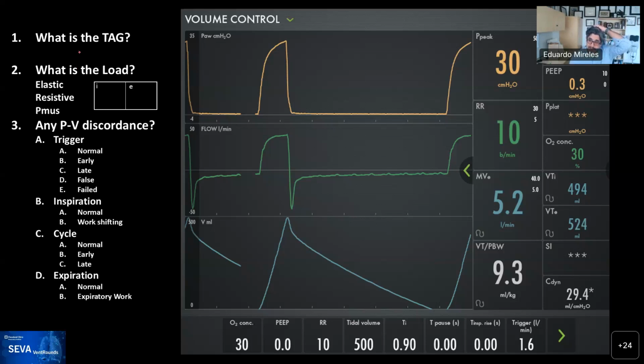One is recognizing the screen, and so this is a Servo-U, and seeing what the mode is, we put the mode all the way on top, and then using either the Vent Mode app or one of what we call Rosetta cards or mode map cards, which have all the cards and the taxonomy. Another is just to go through the whole exercise of learning how to identify the modes, which we teach in the course.